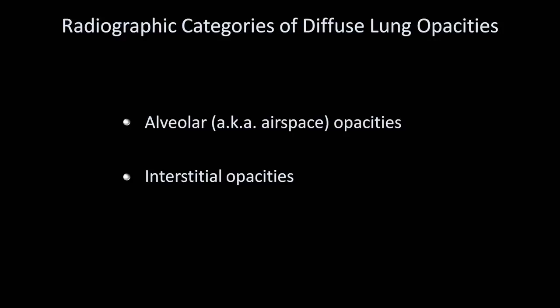It is a skill that entails much subjectivity, requires much experience, and typically shows significant inter-observer variation. A large part of these issues stems from the fact that few diffuse lung diseases are completely limited to only the air spaces or to the interstitium.